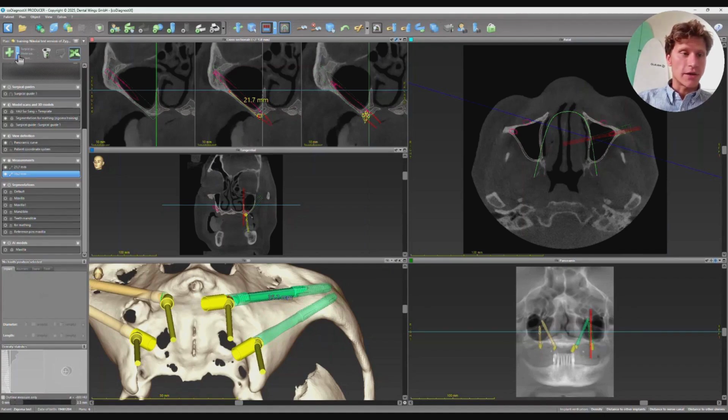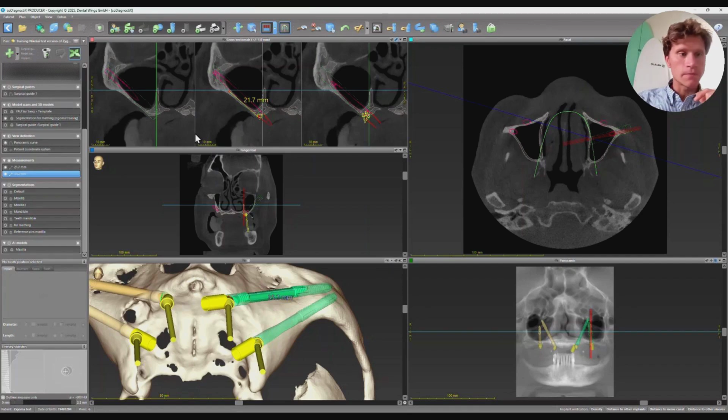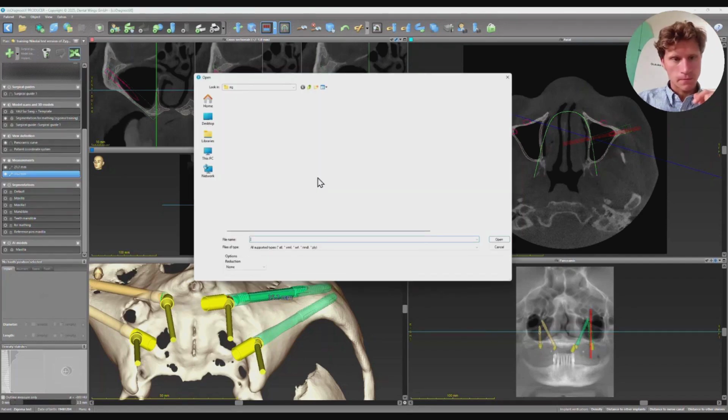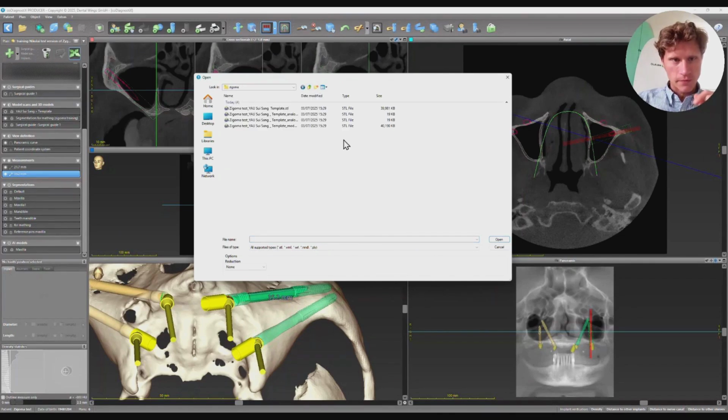So right now I go to the small area here, and I go to 3D model. And I select the folder. And here you have different names of the object, and actually our object, this is analog.